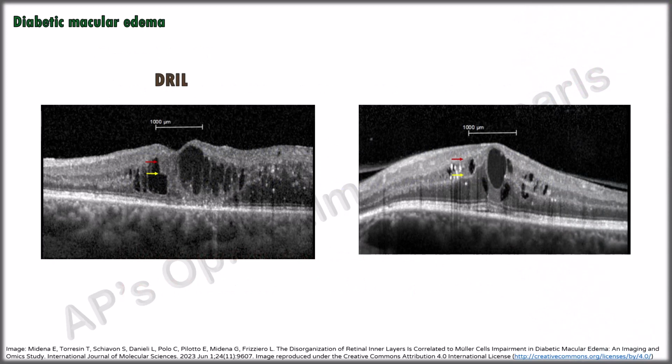DRIL is not an acute finding and only occurs in patients with disease present for greater than 6 months. The presence of DRIL is not restricted to diabetic macular edema, but has also been found in other causes of macular edema such as retinal vein occlusion. However, Radwan et al. noticed that the association of DRIL change with vision change was present only in central diabetic macular edema.